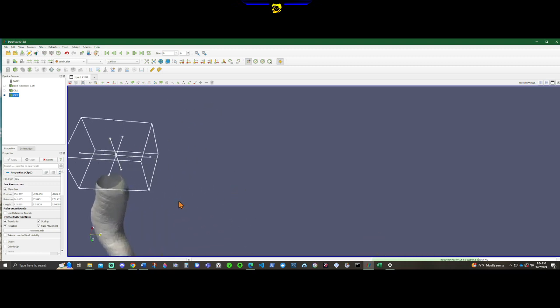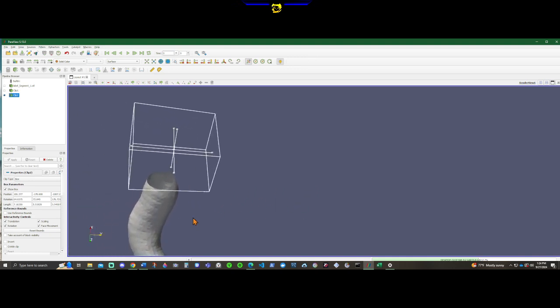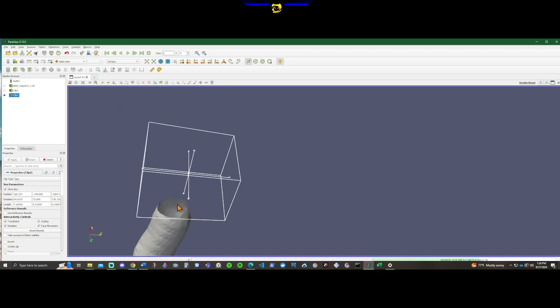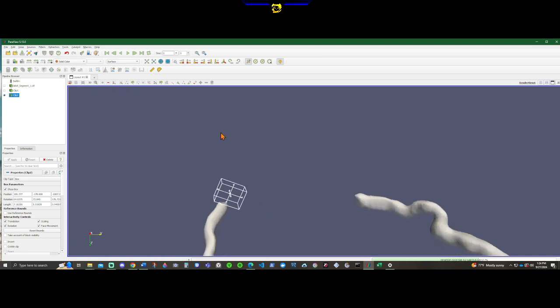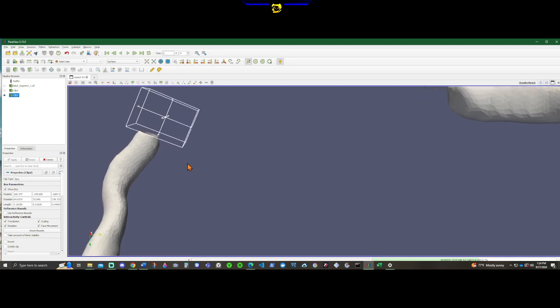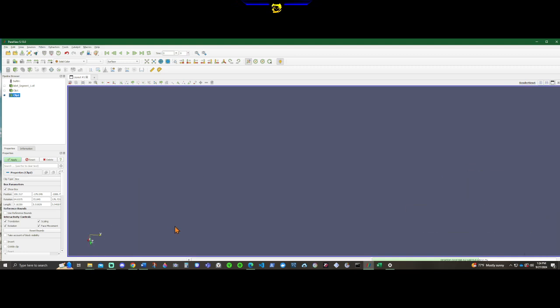So yeah, that's done, but I don't really like how there's this sort of extra little place. So I'll spend some more time right now in case you feel the same way. So I'll just drag it down a little bit more just to get rid of that corner.